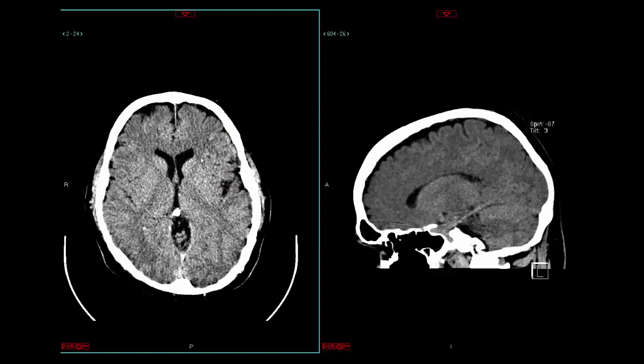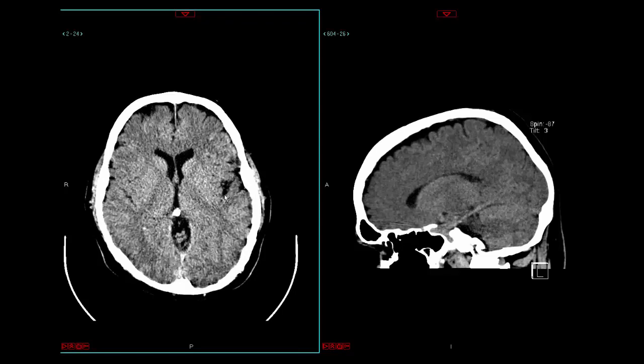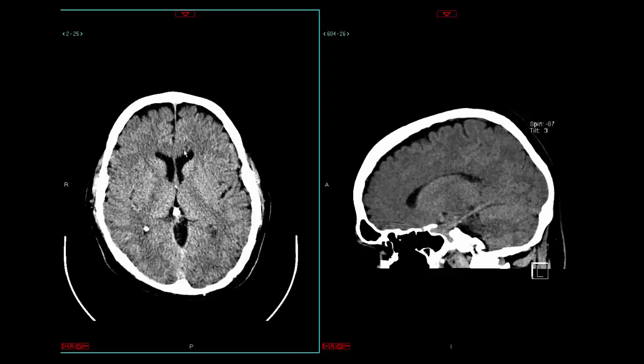Now, while we're here, we'll continue to scroll, and we made the point of saying this is more than likely we're starting to get into the superior temporal gyrus here. Oftentimes people will say at the level of the thalamus. I know we have the cut of the corpus callosum here, but we're also at the level of the thalamus. And the thalamus is this deep gray nucleus right here. We'll go over deep gray nuclei in another module, but it's this paired gray matter structure here that marginates the third ventricle, which you see there.